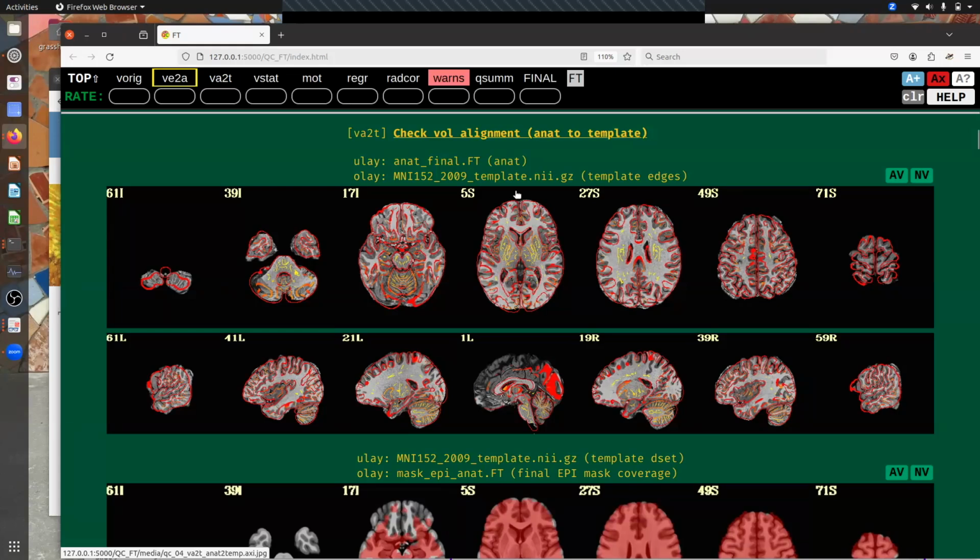If you look down here in this slice, it actually looks pretty decent. And like ventricle boundaries, you can tell that there's some overall general feature mapping, but you can see the lines here aren't great. And actually, when you're looking at the cortex up here, it really looks much more jarring. It looks like maybe a kid scribbled with crayon a little bit. They don't line up tightly.